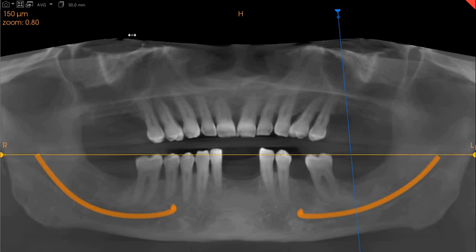We have placed implants, but we will take you through the measurements of those ridges first so that you have a good idea. Now, this is the top right quadrant. This is where the first molar is. You can see we've got a ridge width of 11 millimeters and a ridge height of 4 millimeters. Implant placement can only be done if sinus lifting is done in the upper right quadrant.